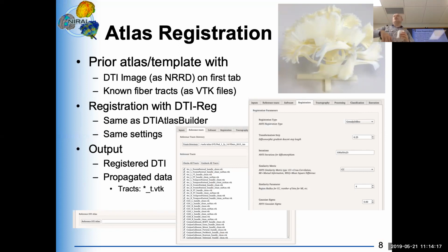You can just use all of them or only individual ones. The reason you're allowed to uncheck and check these is because this procedure is rather time consuming and also uses a lot of memory or space on disk. So it's quite common that you don't want to track stuff that you may not be interested in.